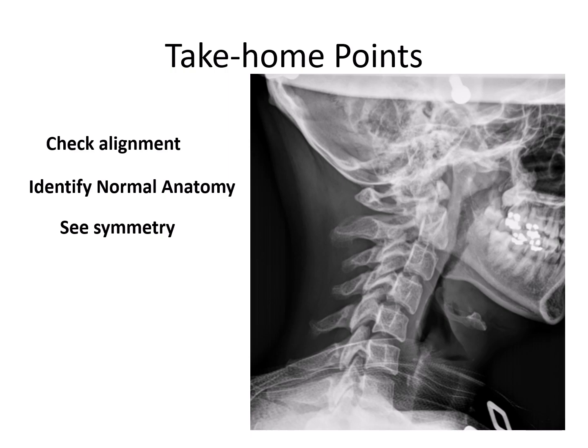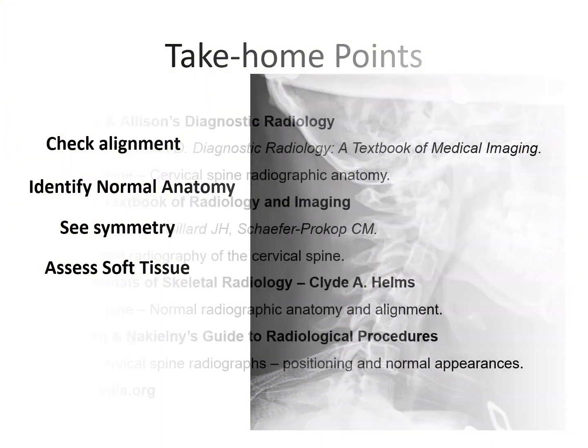Then see for symmetry, that is the height of the vertebral bodies and intervertebral discs, and these lines should be symmetrically placed. And assess the prevertebral and paravertebral soft tissues.